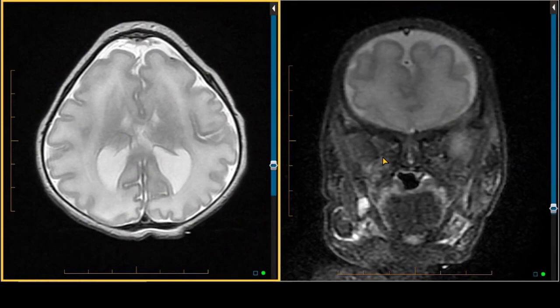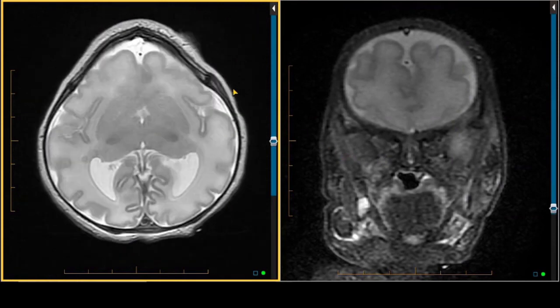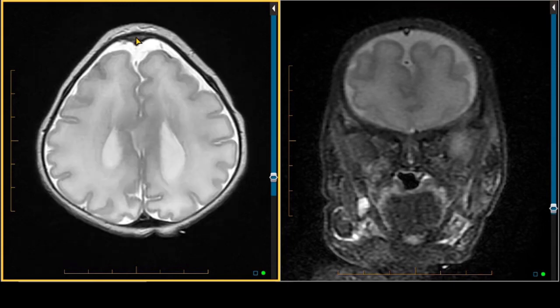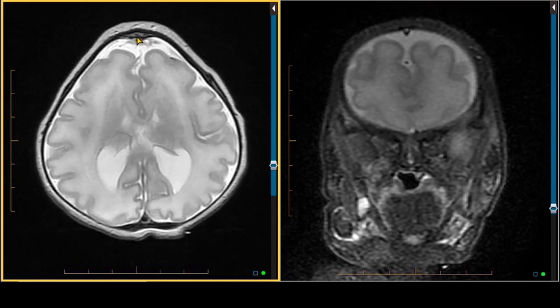This is an MRI of the brain in a newborn that had an abnormal fetal ultrasound. An axial T2-weighted image shows a couple of things. First of all, we see this anterior sloping of the frontal bones that goes up to the midline. And midline, well, we don't get a great view of bone on MR compared to CT. It looks like there's actually bone continuity between the two frontal bones, whereas at this young of an age, the metopic suture should be there. So this raises the possibility of metopic suture craniosynostosis, which can result in a skull configuration known as trigonocephaly.